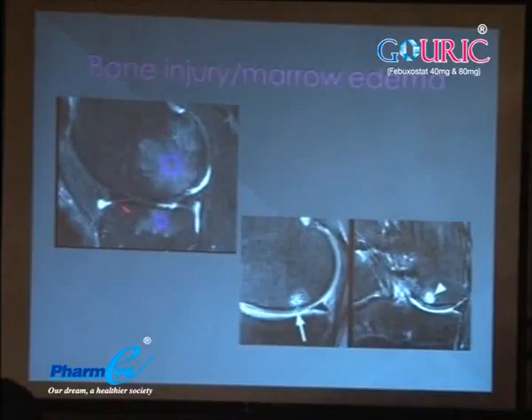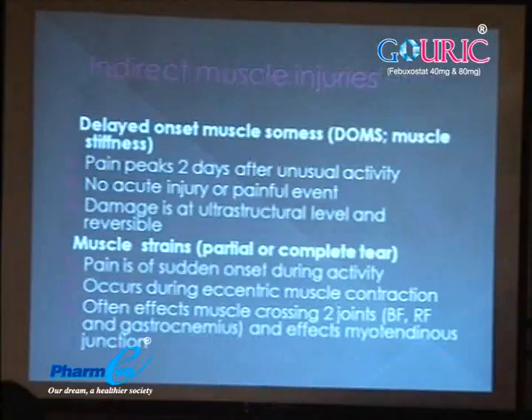This is due to edema, bone edema, and this is what you get when you have bone injury. There may not be a fracture, but the bone is injured and it reacts by accumulating fluid in it, just like you would have edema anywhere else in the tissues. And sometimes this will help you look at the underlying cartilages and ligaments, and this will be the area where you will look more carefully.